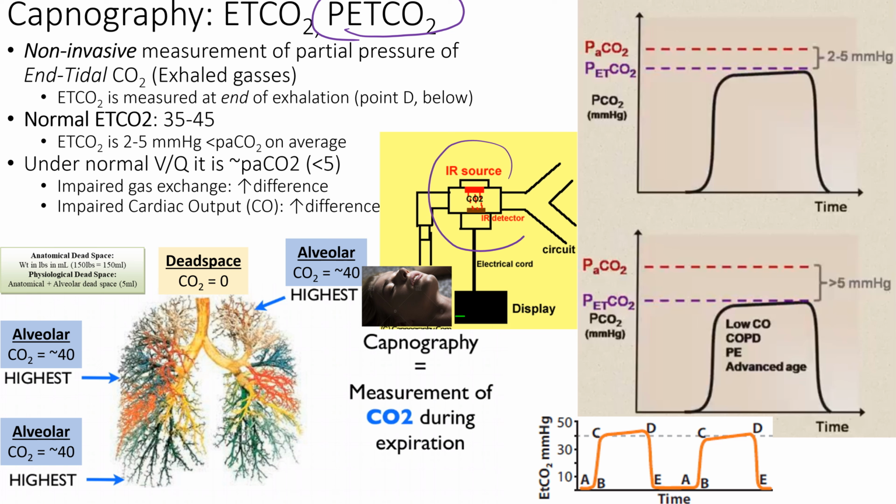And this little IR sensor, like on our Zoll monitor, when you exhale CO2 here, it's going to pick up that CO2. And when you're inhaling, there is no CO2 being delivered by the ventilator, so it's going to eliminate that waveform. The waveform is going to plummet down to nothing because it's only picking up CO2. When there's oxygen going across, there's no CO2 residual, right? And then when you exhale, the CO2 is going to be on the monitor, on the waveform. You're going to be able to pick up the CO2 being exhaled, right? And those numbers mean something, okay?